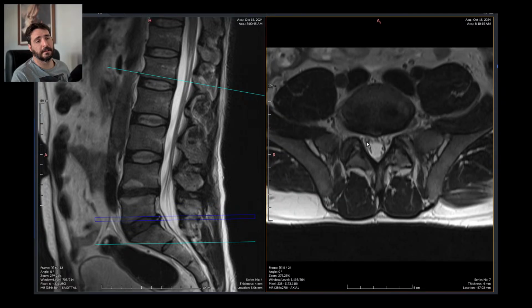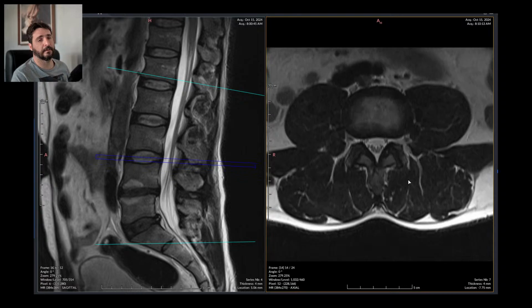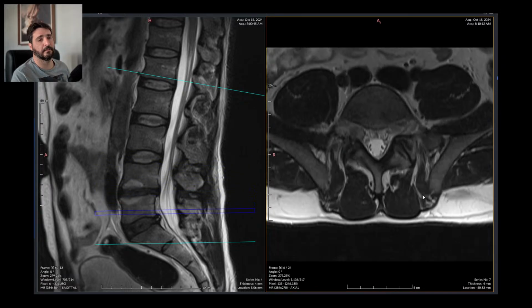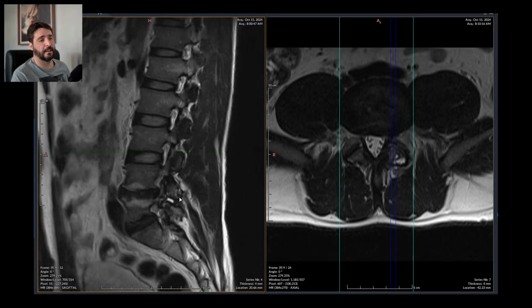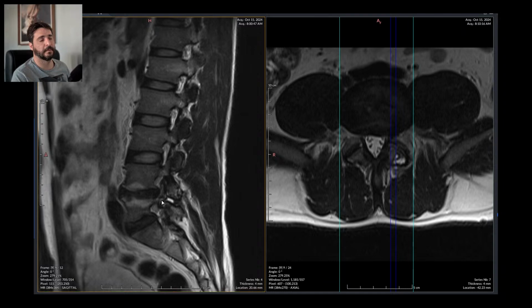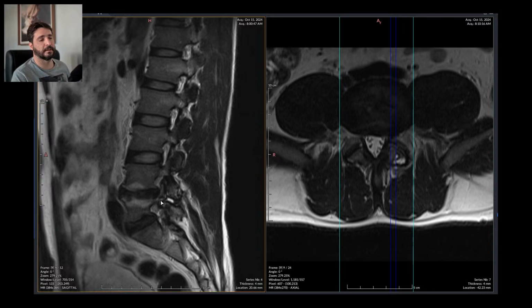And on this side there is no vertebral canal stenosis, and I could say there is a mild stenosis right here. Also might be a case of synovitis. Yes. Arthrosis. There is a fracture with a pseudarthrosis of the isthmus of this joint right here.